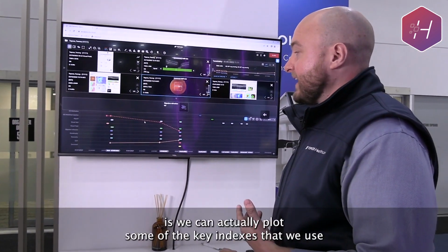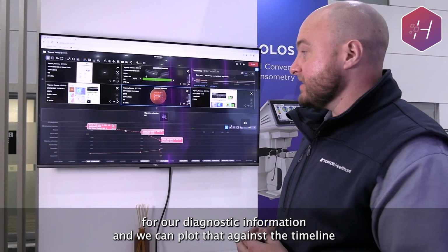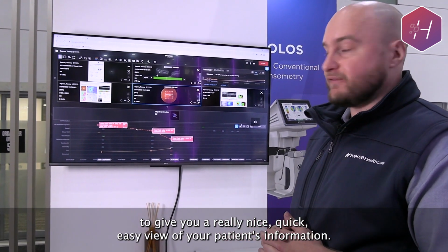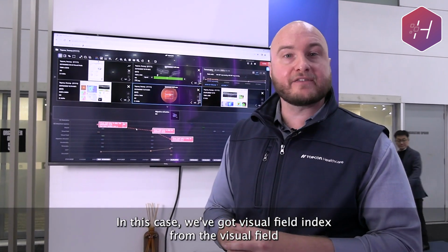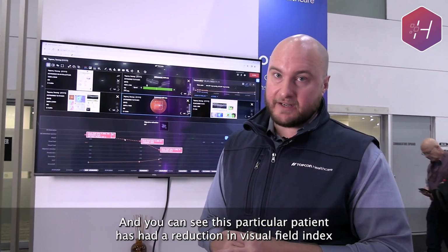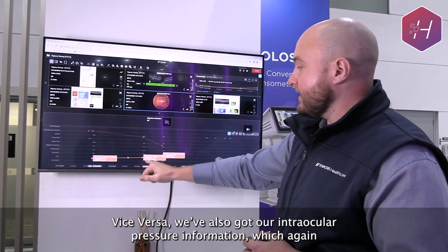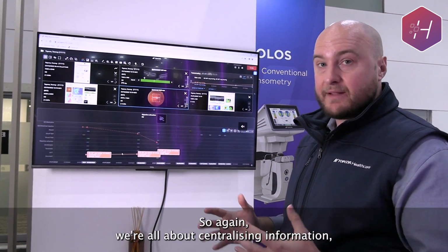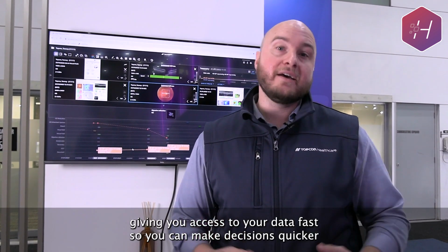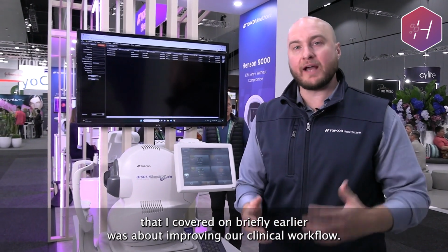Another thing that we can do is plot some of the key indexes that we use for our diagnostic information, and we can plot that against the timeline to give you a really nice, quick, easy view of your patient's information. In this case, we've got visual field index from the visual field, and we've plotted that over time, and you can see this particular patient has had a reduction in visual field index. Vice versa, we've also got our intraocular pressure information, which again is showing an increase in intraocular pressure. So again, we're all about centralizing information, giving you access to your data fast so you can make decisions quicker and improve your workflow.